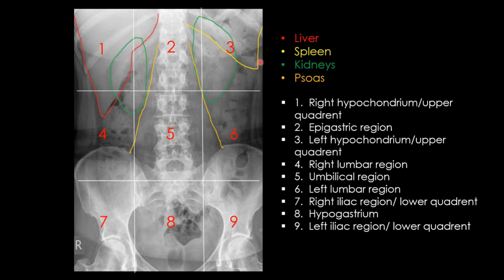You've got the spleen roughly up here somewhere, sometimes very difficult to see. You can look for hepatomegaly and splenomegaly, so enlargement of the liver and spleen, but again it's very difficult to look at on X-ray. You can look at ultrasound and CT for things like that, but occasionally you can see a big shadow of the liver coming down below the iliac crest and across.